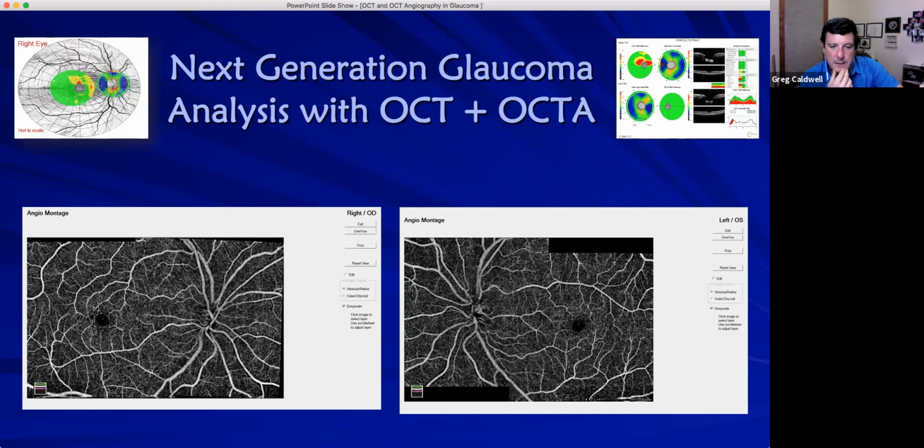Moving into other conditions, you may want to use the B scan OCT, like in that Plaquenil toxicity, or maybe looking at epiretinal membranes or vitreomacular traction, really not capillary diseases. So the crime must fit the punishment. If I want to evaluate macular degeneration or diabetes, I want to have OCT angiography as my early detector rather than the B scan, and vice versa for things that could affect the structural part of the retina. Here, it's been a nice little mix. I'm not really going to defend one or the other.